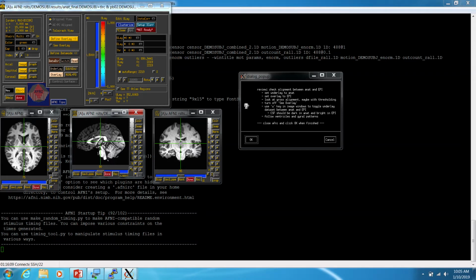And most of the time it does a great job, but sometimes something weird happens, and you can usually see it in this. It's like, whoa, wait a minute, why is it flipped like that? And I mean, if you typed the letter Q and put it into the same space, this program would find a visual solution to match that up as best as possible. Right. So it'll find a solution. It just, the solution might not make any sense. So that's really what we're checking here.